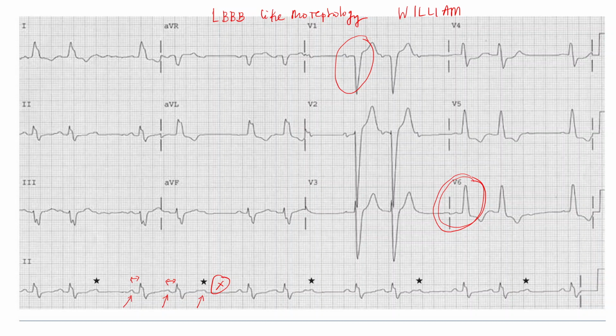Now what is the significance of that? I will be telling later. Just remember, whenever you are getting a wide QRS complex, always try to find out what kind of bundle branch type morphology. Significance of this I will be telling in the subsequent slides or maybe in the subsequent lectures. So I must tell one thing: you have to see the bundle branch block lecture. If you have not seen it, you have to see it and be very thorough in that concept, because as we read more about the arrhythmias and the ventricular rhythms, it will be very difficult to understand if you don't know about the bundle branch block morphologies.